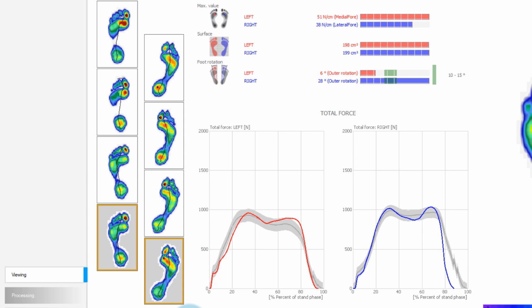This mean representative step is determined by observing the pressure distribution in all recorded data and the course of the COP for each recorded step. The imprint that comes closest to the resulting mean value in this observation is determined as this representative. Please note that when less variance is measurable in the recorded print data, this selection becomes more stable.